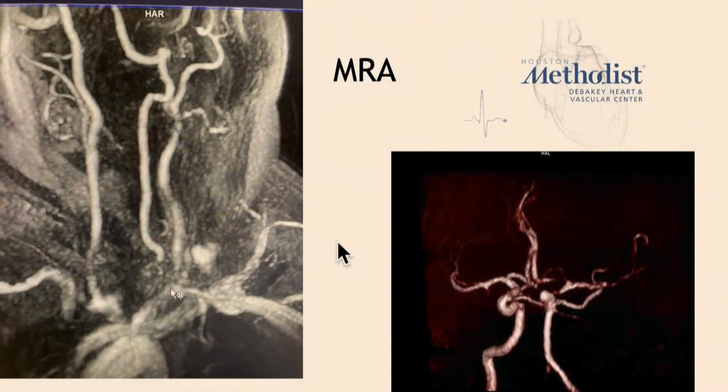What you're seeing here on the left side is the carotid, but I don't see a bifurcation. You see a very strong left vertebral, and I do not see a right vertebral. We did not see the right vertebral, so that's not seen or occluded. We just call it not seen on our ultrasound, but here is confirmation by MR that it is occluded proximally at least. Very interesting that at the tip of the basilar we see an aneurysm, and the distal intracranial part of the vertebral was actually open.